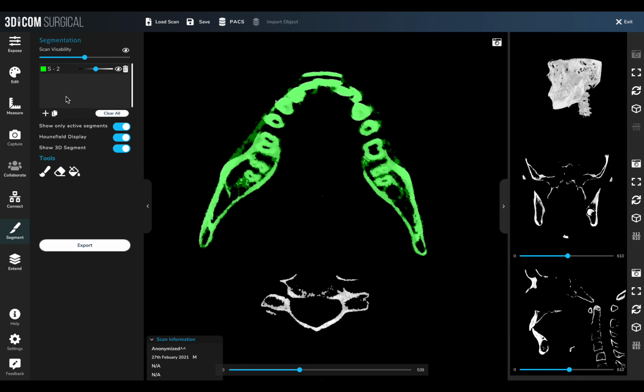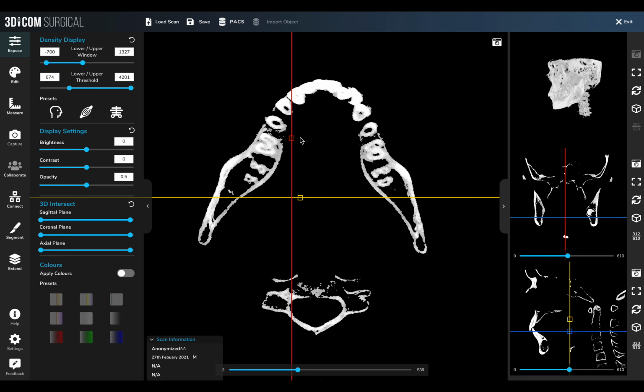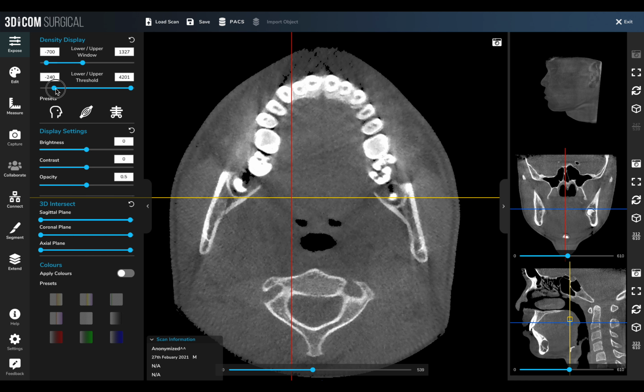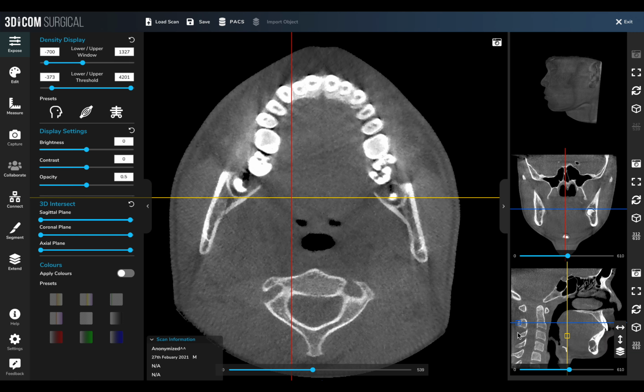So I believe it's exporting now. Yeah. And it does actually export, and you can see the STL files. So it is working functionally, but there's other components that need to be fixed. And then from an orientation point of view, I believe, according to Jason, that the scan should actually be oriented this way, with the spine, the posterior to the left and anterior to the right. But all of that orientation can be checked. Thanks.